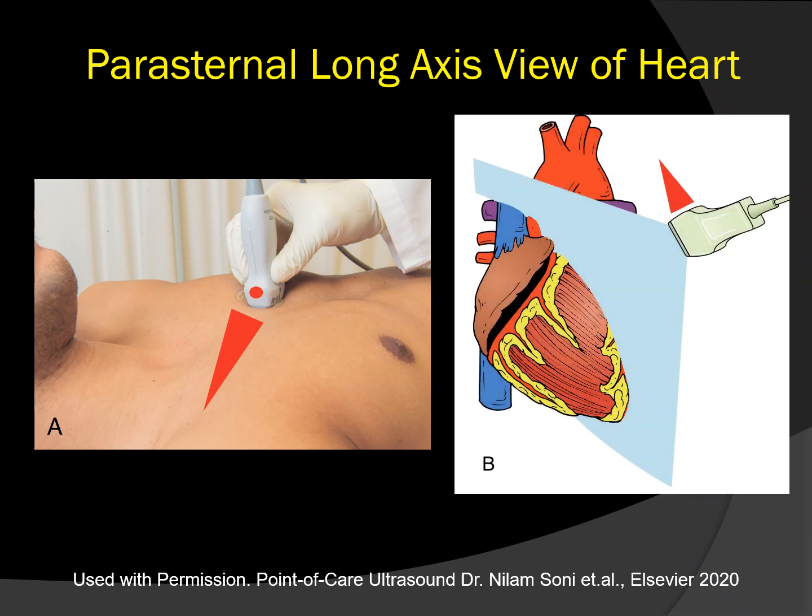The image will be slicing the heart as is seen in this cartoon image. It would be extremely helpful if you have access to a 3D model, thereby allowing you to better visualize the images on the screen if you are able to obtain a 3D model that allows for a parasternal long axis cut.